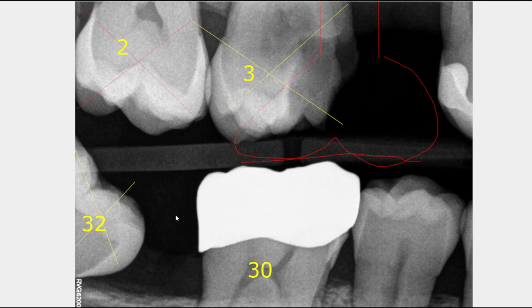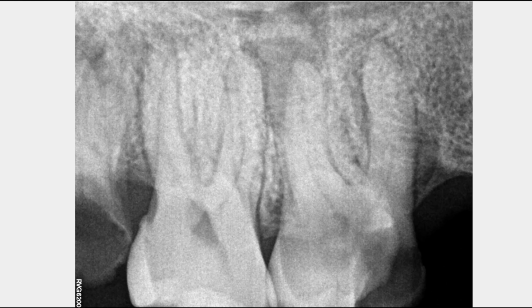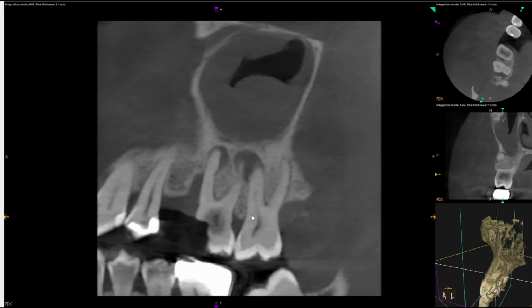So these are the actual images I showed to the patient. I've already messaged the dentist telling him what we want to do. He said that sounds great. And this is the benefit of doing the images. If it had just been, we just take this image and maybe an angled one, like they taught you to do back before cone beams, cool. Well, maybe we can save this tooth. Maybe you'd catch that there was a deep probing here. But that doesn't tell the whole story. This tells a lot more of the story about what's going on, the deep level of decay.